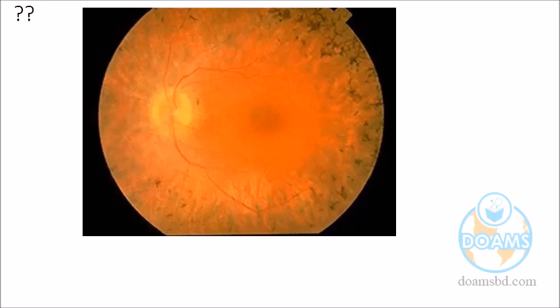Primary. Farial, again, please try to understand. Primary means the optic disc is the problem, while the rest of the retina is normal. This is typically called primary optic atrophy. So yes, your retina is not normal.